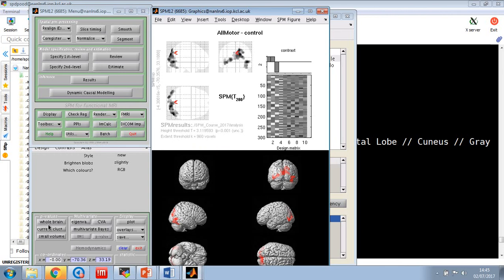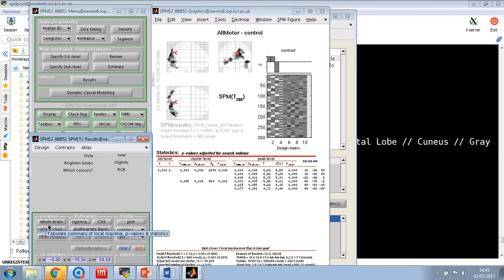So click on whole brain to get back the stats page. Okay, so that's our cluster corrected. The last thing you might want to do, well, it's two things. You want to save the map, so save threshold in SPM. So that will give you just this blob map, so then you can overlay it on something with thresholded. So in the view we took the SPM T map, which wasn't thresholded, and you could apply a threshold using that slider. Here you can just save out just these blobs. You could also save it out as a binary array for a mask, for example.